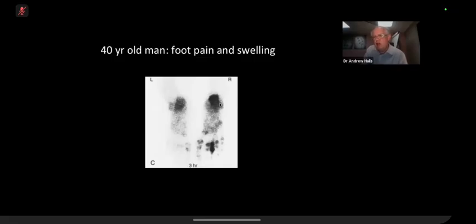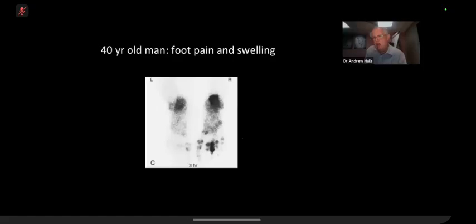From where this is, would you like to classify it in slightly different ways? Osteomyelitis is fine, but where is it? It's in one of the toes, probably the third toe, the middle and distal phalanx probably. Yeah, it's on either side of the joint, isn't it? I mean, it might involve osteomyelitis of, say, the metatarsal and the proximal phalanx. But obviously, I think the joint in the middle would also be involved.